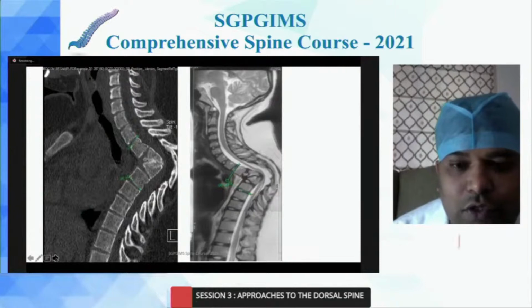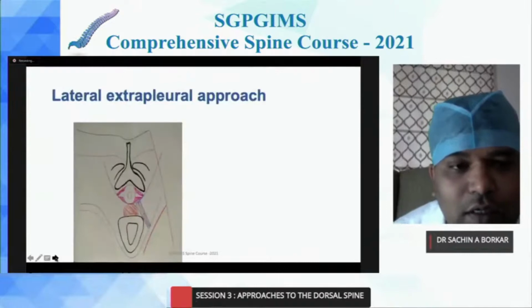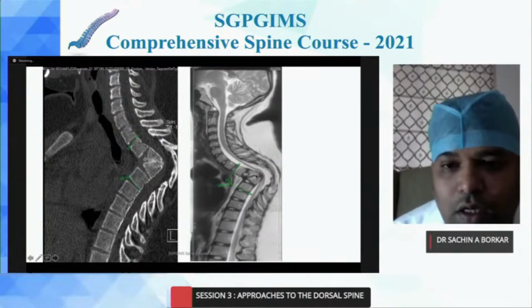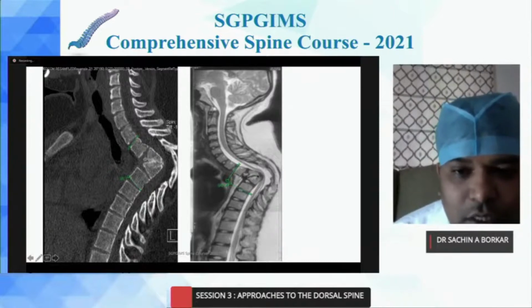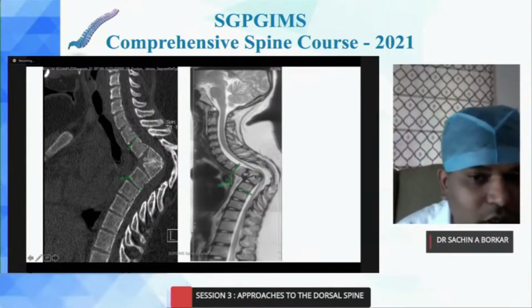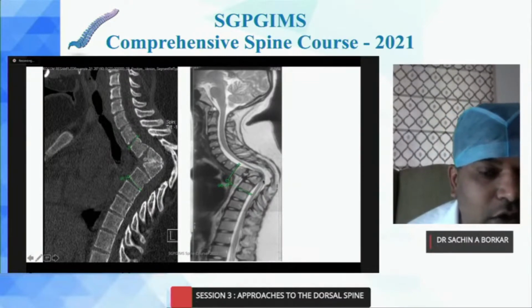Another case, this case is a rigid kyphosis. Just a point to tell, at times in lateral extracavitary approach, what happens is when you are doing this part of the drilling in a prone position, this is still a very difficult area to drill because the cord is falling on your drill. You can just imagine that the patient is lying prone and you are trying to drill an internal gibbectomy from a posterolateral approach, and this area is very difficult.